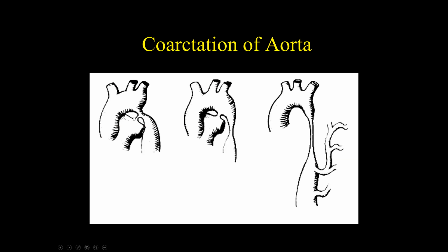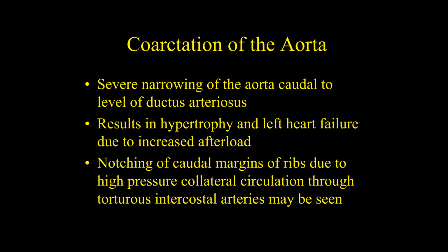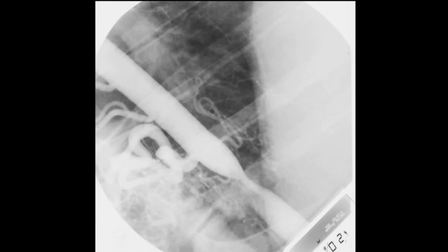And this is where the aortic arch, you can see it coming around in here, you get a stenosis of the aortic arch somewhere in the descending aorta, and it can be really severe, okay? And it's a congenital defect, again. Most of these dogs will have a pretty poor prognosis because obviously you have this narrowed aortic arch, and that will allow poor blood flow and less oxygenated blood flow to go to the rear limbs and the trunk. Okay, so that's coarctation of the aorta.